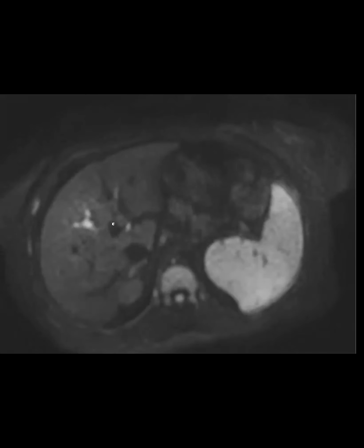Or should I just show the cases? Well, what I see is high restricted diffusion in the hepatic vein that is joining up with that TIPS. Are you worried about this restricted diffusion? What will you be thinking about it? Yeah, I want to look at the post-contrast images to see if there is tumor thrombus.